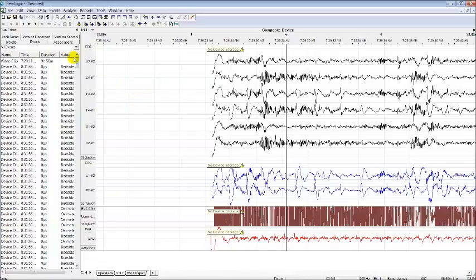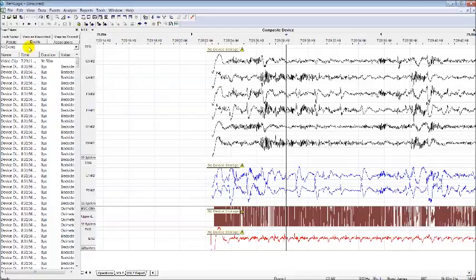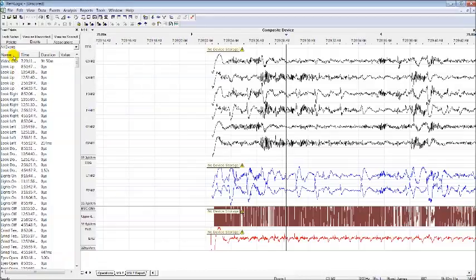I would suggest that we use the event palette to call out this function. You can just go to view, workspace, event palette. To do this I would normally click 2 times on name so that it will arrange everything here.